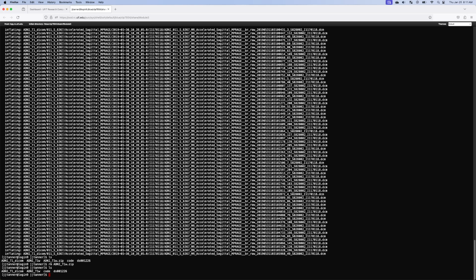And there's only 2 images in this new folder that we extracted, this ADNI T1 dicom. And so we're going to do this by hand, meaning convert and move this into this structure by hand. And this was shown in class in the video. We'll try to recreate this.